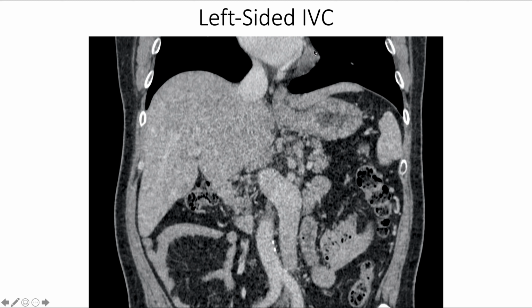In this coronal CT, we can appreciate the heart, superior margin of the liver, and the structure connecting them, which would be the inferior vena cava. In addition, we can appreciate two large abdominal vessels that are spiraling in the abdominal cavity, one of which bifurcates. The bifurcating vessel is the abdominal aorta, and the other vessel that is approaching the liver is the inferior vena cava.